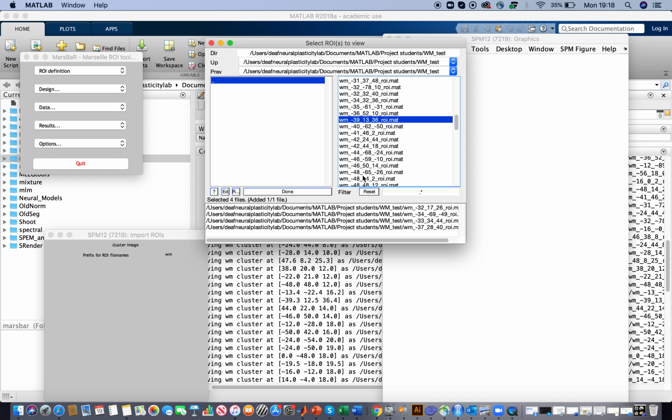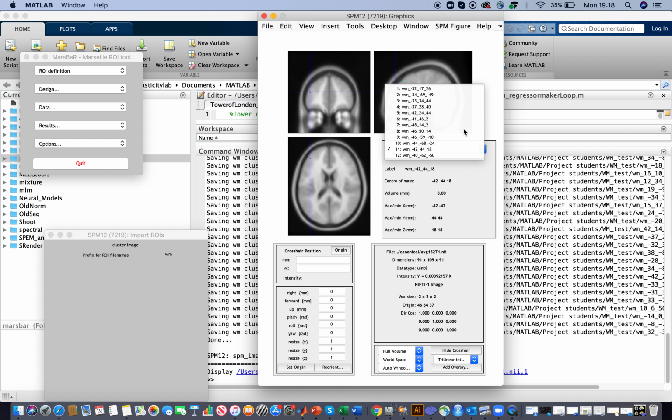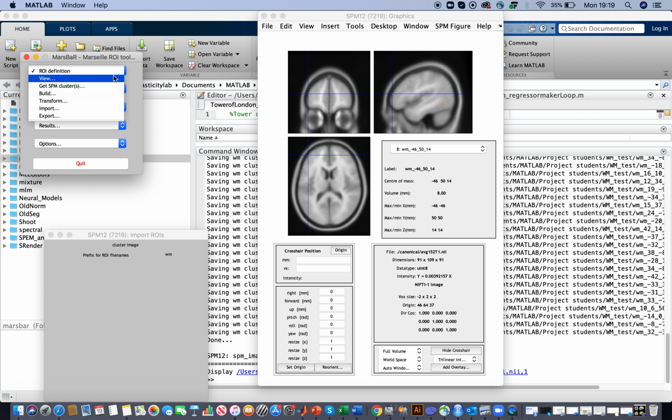Another problem which may be relevant when you decide to do a region of interest analysis is that you probably want to keep your region of interest constant from the size point of view, but as you will see, these clusters have quite different sizes, and there are clusters that are very big and probably will not be very informative for analyzing data.